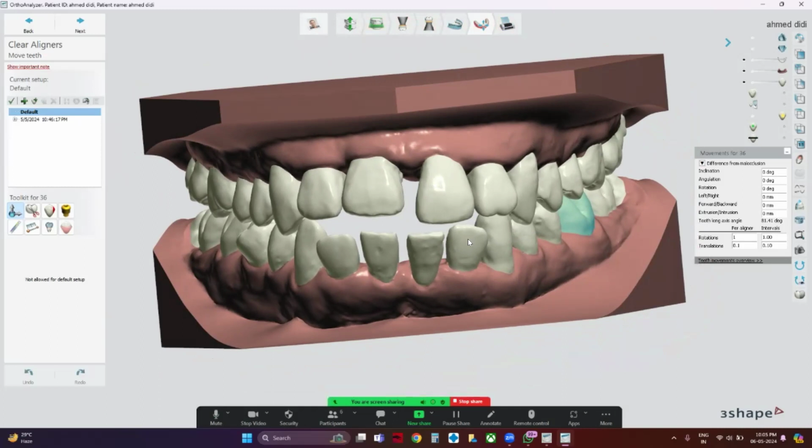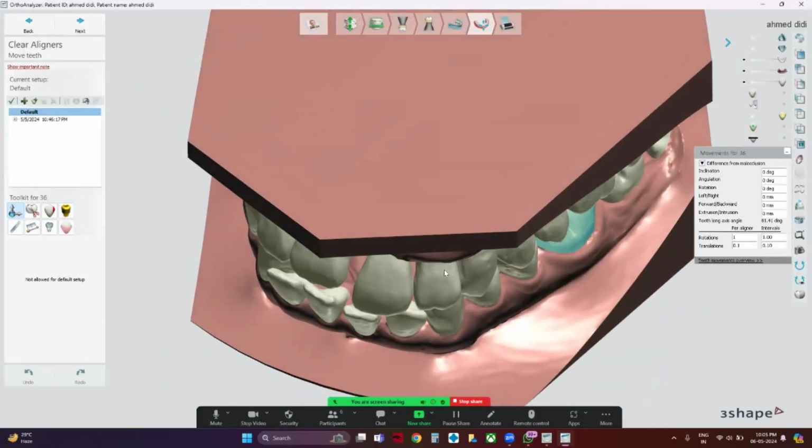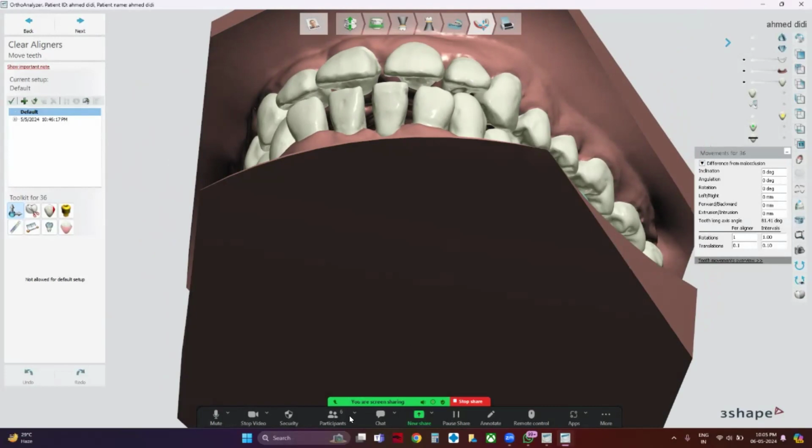but to improve the smile, we have suggested the aligners. He's from abroad, so we are planning aligners. Otherwise, ortho would be ideal, but we are giving him aligners. First he was going to do only lower, but upper also we are planning to do now.